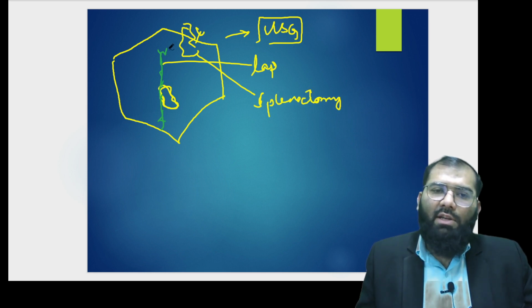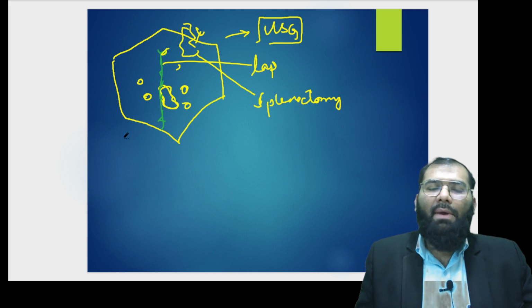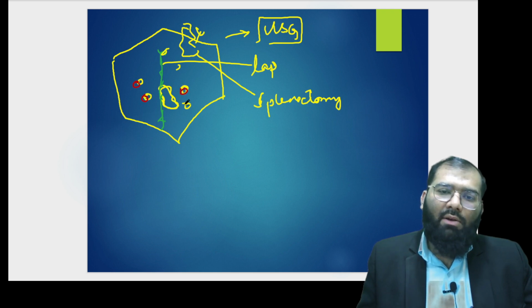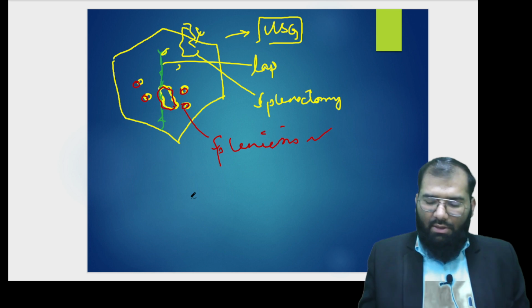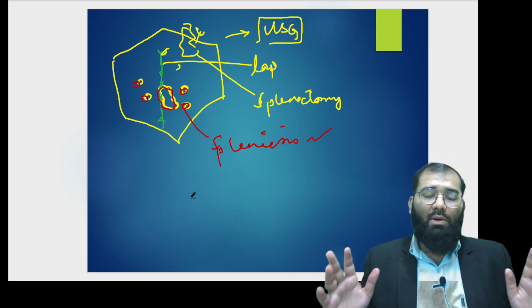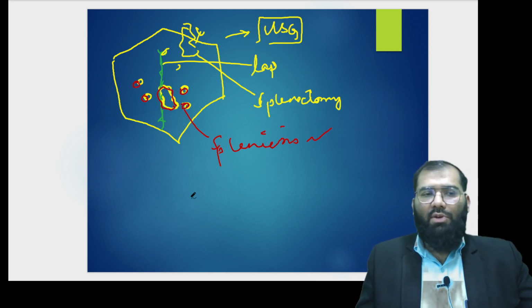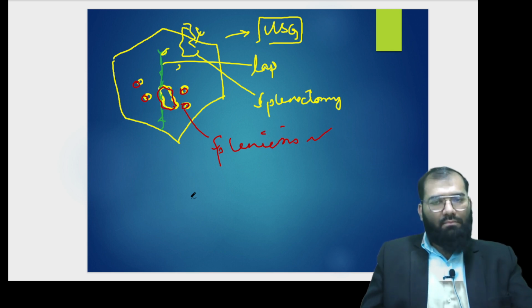But remember, when the spleen gets shattered, some splenic tissue can dislodge in the peritoneum, and this might later develop into small spleens inside the peritoneum. This is known as peritoneal splenosis. This is a very important combination: when you see abnormal, weird masses in the abdomen which are enhancing like spleen, and the spleen is missing, with an old history of laparotomy with splenectomy, we gave the diagnosis of peritoneal splenosis. This is how you need to think clinically when patients come to you, so that the diagnosis gets established. Hope you have enjoyed the talk.